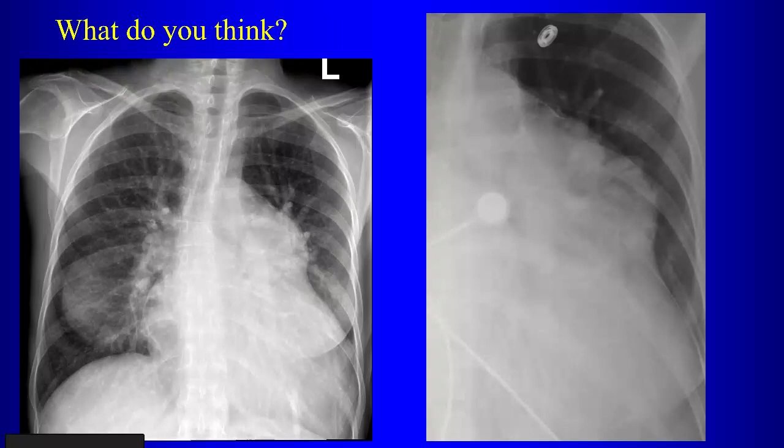What do we think of the close-up? Do we notice any calcifications? Remember, this talk is on calcifications. So in that close-up view, do we see an abnormal calcification? Patent ductus. So where's the calcification? At the ductus. Well, anatomically, if you're describing the plain film to me over the phone, you would say there's calcification along the AP window. And in a patient with pulmonary hypertension and big central pulmonary arteries, we have calcification in that region. You suspect the patient has patent ductus arteriosus. So the patent ductus arteriosus causes what?